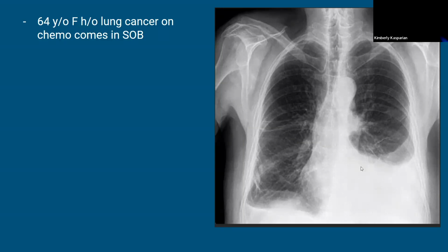No problem. That's right. So no air bronchograms. The meniscus, like the way the fluid... Yes, absolutely. Basically, if it's a true lobar infiltrate like that other one, it'll be more squared off and flat. And then here it's kind of down sloping and you can kind of see the effusion there.